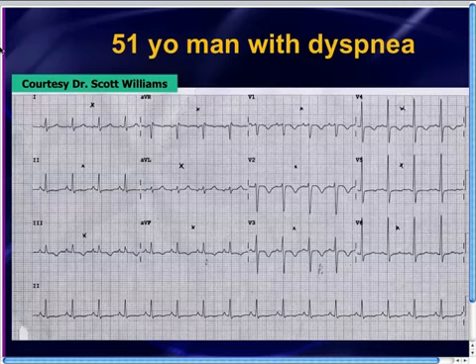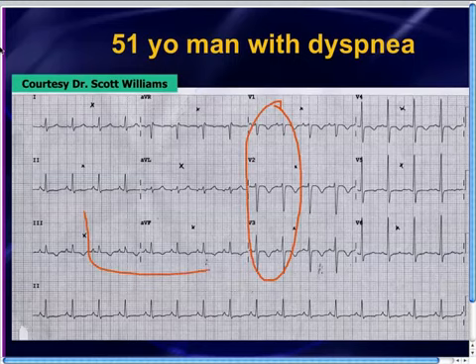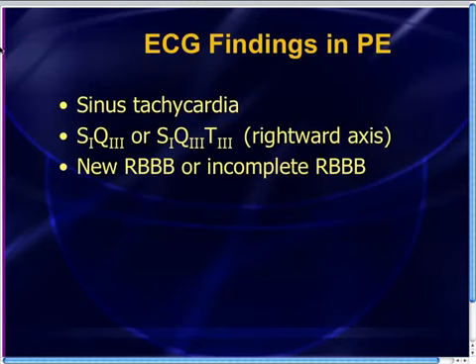And what they noticed on this EKG was a bunch of T-wave inversions, which at first glance would make you think that this patient's shortness of breath is due to diffuse cardiac ischemia. However, they knew a little bit more, and what they were able to diagnose based on this EKG, the presence of T-wave inversions in the anteroseptal plus the inferior leads together, turns out, as we've talked about before, that EKG abnormality is very highly specific for pulmonary embolism. That's what this patient ended up having.